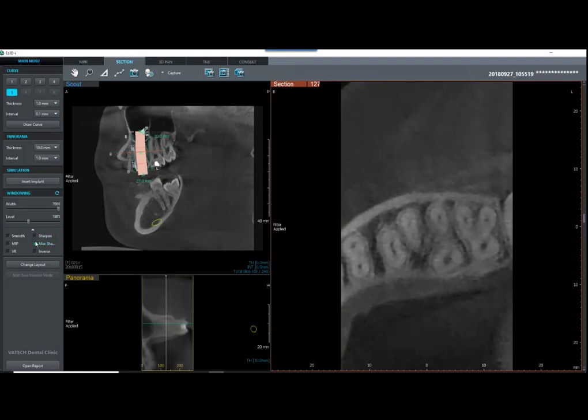We are on a 12 by 9 scan, so we're on a larger scan. The next couple scans we're going to look at are going to be our 5 by 5. As we scan smaller, our voxel size here is between 0.12 and 0.2. If we go down to our 5 by 5, we can go down to that 0.08 voxel size, and we're going to look at some differences in the imaging when we do a smaller scan. But let's continue here.